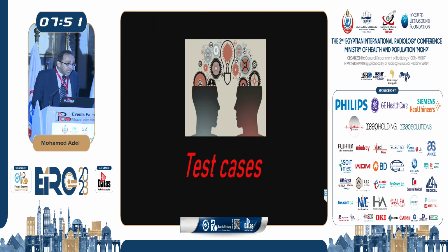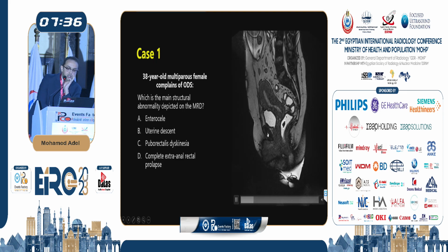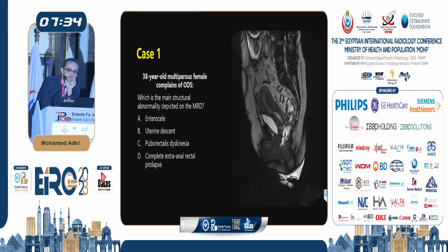I'll move to some quick cases just to review what we're seeing. Please, I'd like to get your attention. This is a 38-year-old multiparous female. Her main complaint is obstructed defecation. But I want you to look at the image and tell me what you can see.